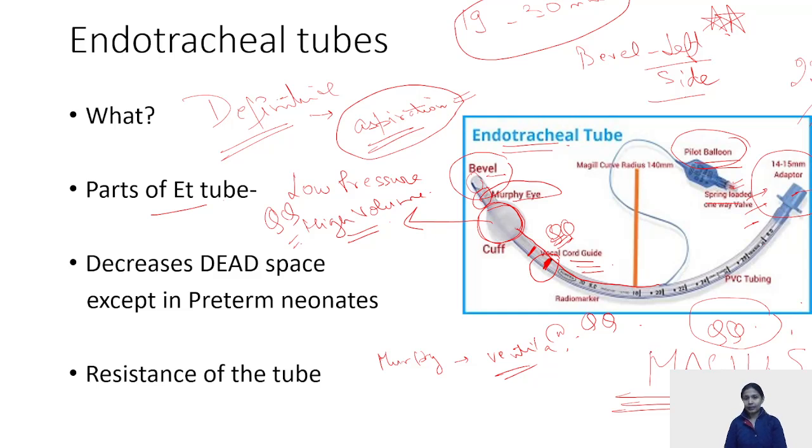I hope I'm clear. This tube is present in the form of a curve, and this is known as the Magill's curve. The radius of this curve is 140 millimeters.